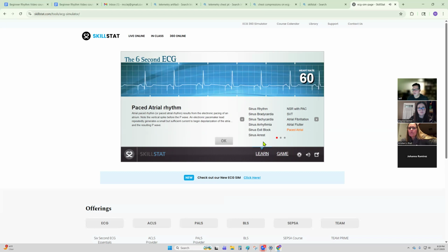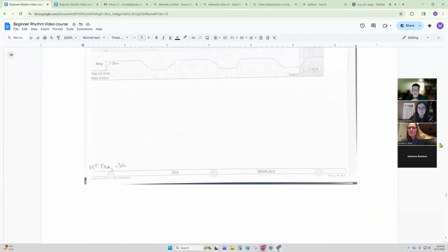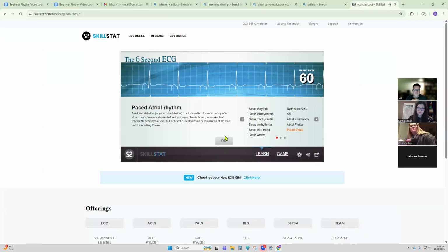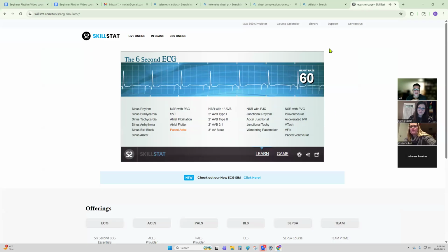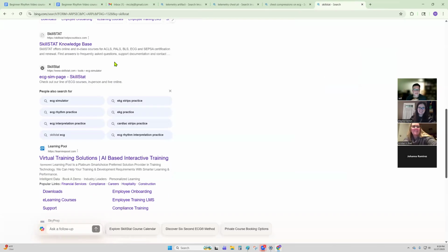Oh, we didn't talk about pacers. I'm sorry. Might have touched on it briefly last time. I am just going to stop this real quick. But that one does have a pacemaker.